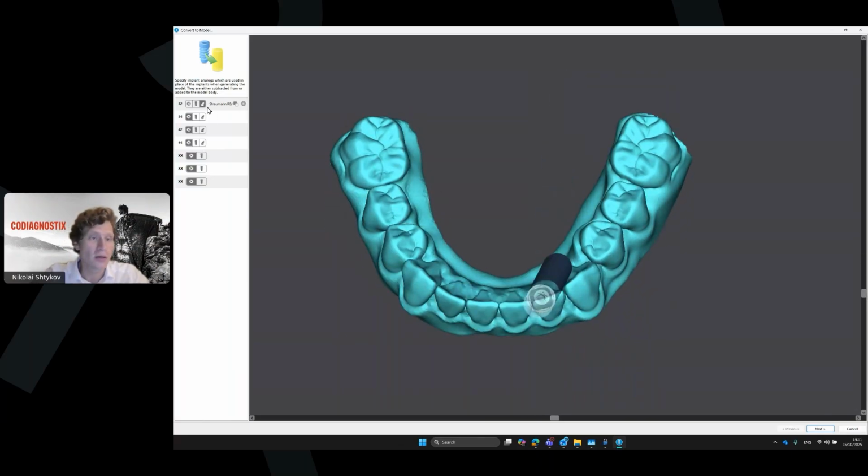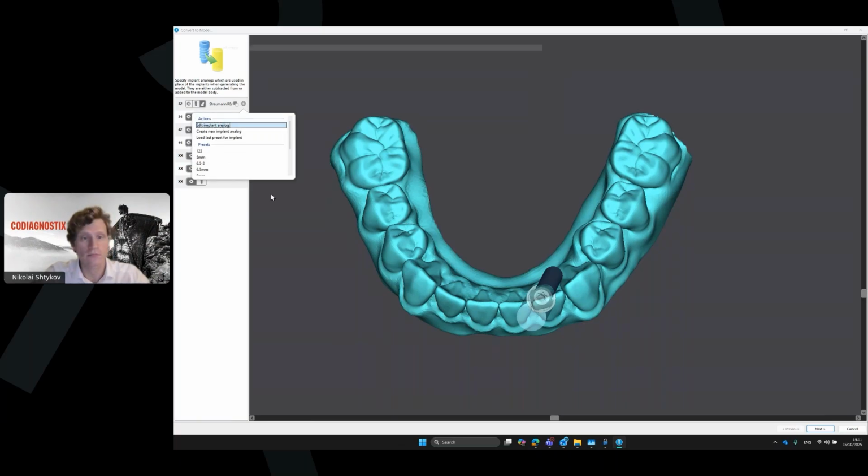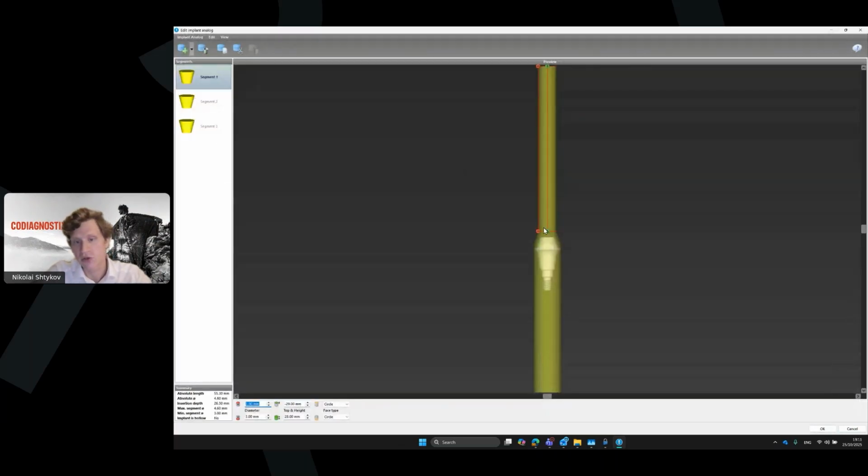Or I can change it for my preset for SRA hole. You see that I create this like this. So I just measure to have some space for the temporary copings, but you need to be precise because you need to glue these temporary copings one by one, because you will not have space to place it just from the top. And then I click OK.